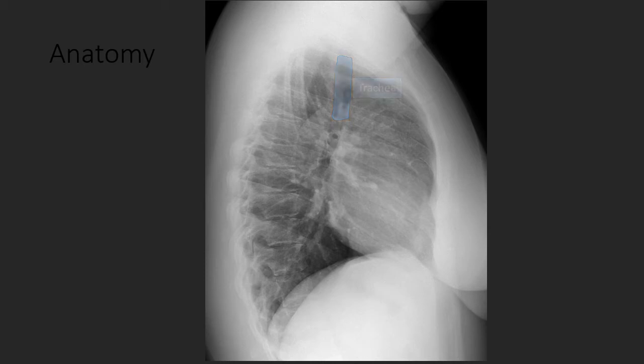The trachea is then going to divide into your right mainstem and your left mainstem bronchi. Your right mainstem will then give rise to your right upper lobe bronchus, though because it's very short, we're not going to see it well. Both your right upper lobe bronchus and your left mainstem bronchus are going to appear as circles on the lateral radiograph. Do you remember which one is higher? The one that's higher is going to be your right upper lobe bronchus. The one that's lower and larger is going to be your left mainstem bronchus.